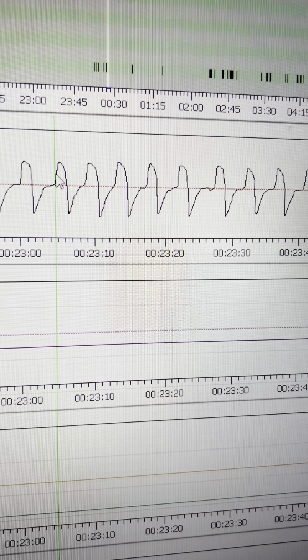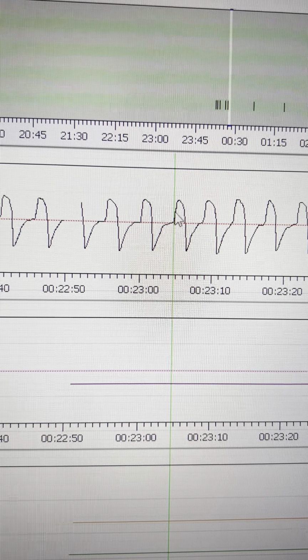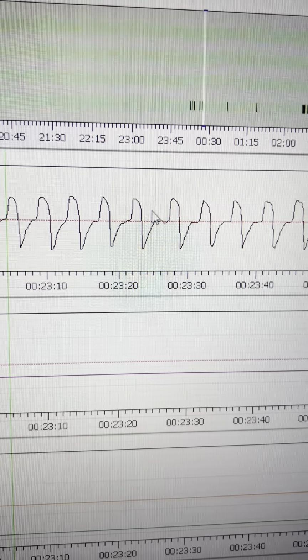Cold hands also happen a lot when I wake up, but those are also dissipating more quickly now after I wake up. So that happens when you titrate your PS or EPAP properly and such, and your ears.